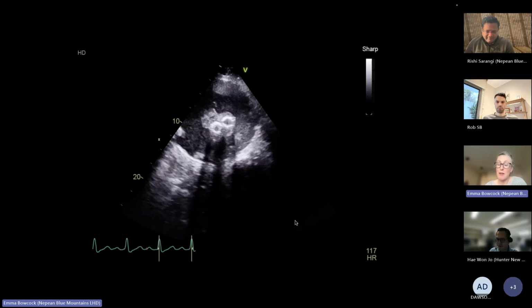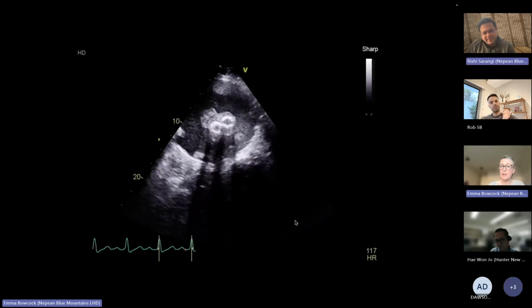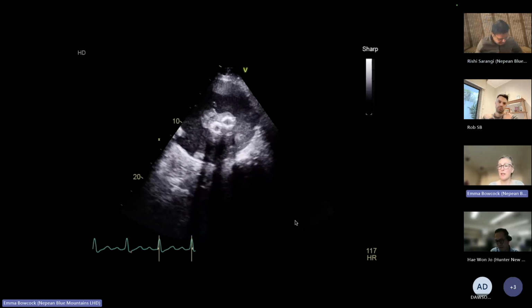Yeah, this is scary. You need some clinical context for this, right? So this man had a ruptured AAA in the past and had an EVAR, and he had an endo leak, which they tried to fix in the past, and he was no longer having an endo leak, but the sac had increased in size. You're seeing two lumens because it's where the EVAR graft is bifurcated into left and right iliacs, and he had completely occluded the trouser leg, which is the left, the night before.